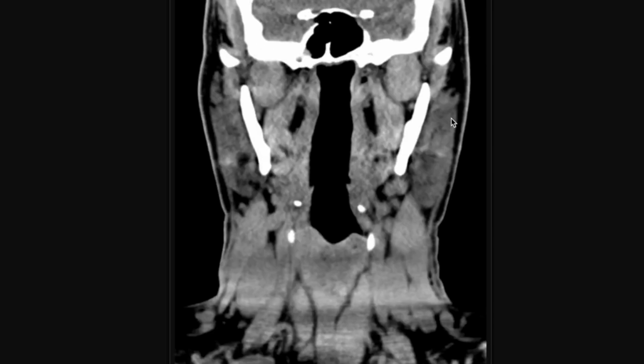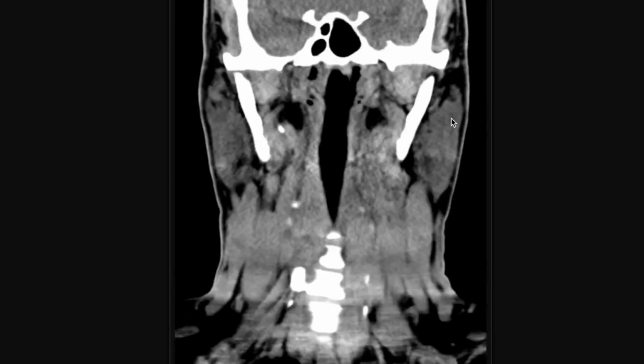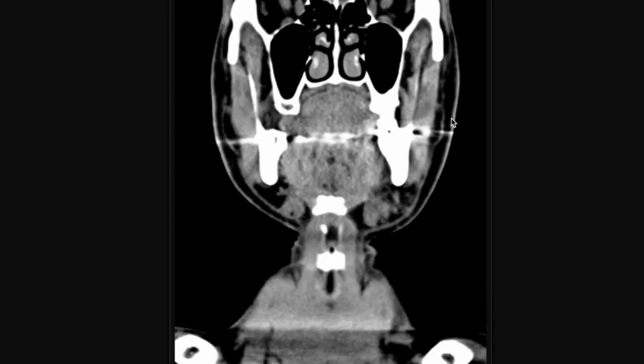And if we look further, we can see obviously the parotid appears normal, and all the neurovascular structures appear normal respectively, along with the temporalis, the masseter, the condyles of the mandible, the sinuses, and the conchae, along with everything else.